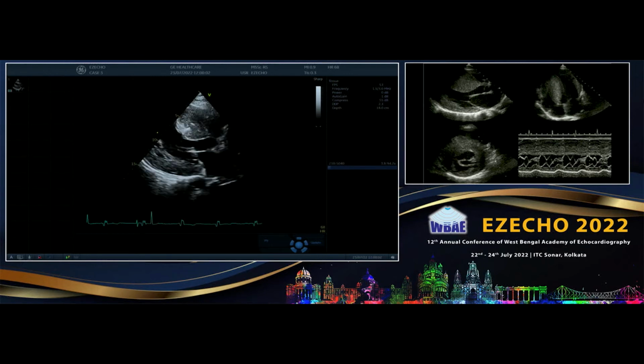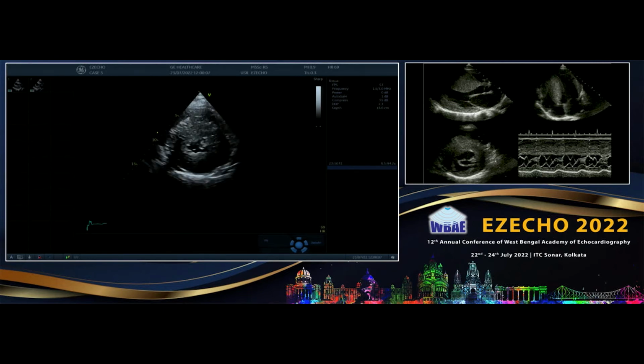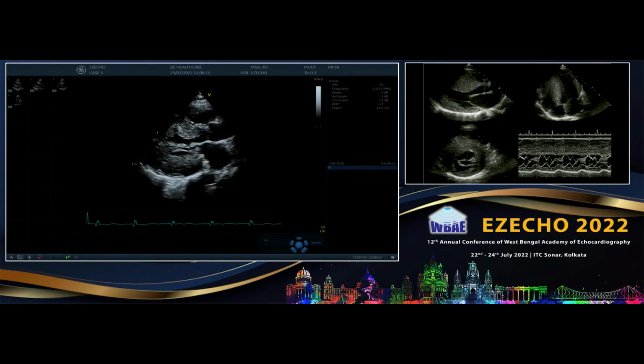Thank you, sir. The annuloplasty ring is around 3.8. What sizes do they get? Because at 38 and above, they start putting it. So we are at the hypertrophic cardiomyopathy.